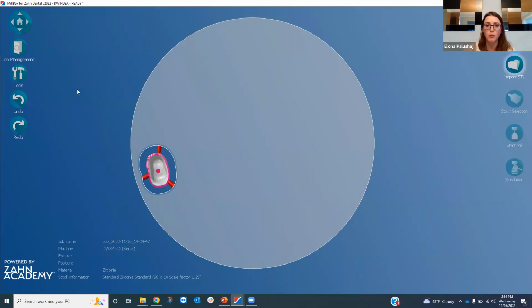I'm only showing a couple, but there are a lot of options that the software has that are features only available for advanced, mainly targeted towards making your work more efficient. So have that conversation with your sales team and see what works for you if you don't have the advanced feature. And if you're not on the latest software, definitely recommend it.